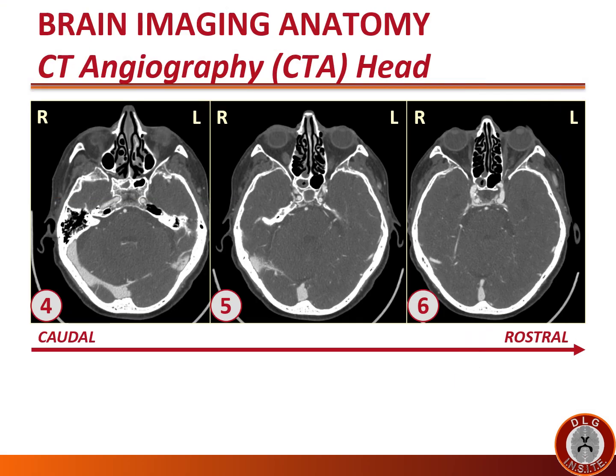Can you identify the main arteries in these three CTA head images? Can you identify the arteries labeled on these three images?